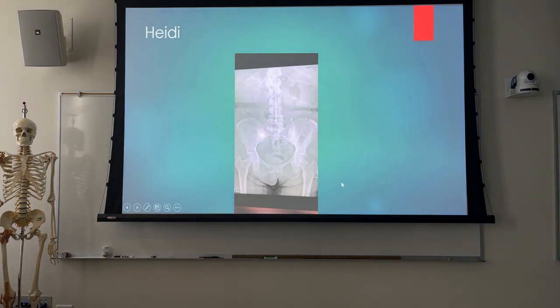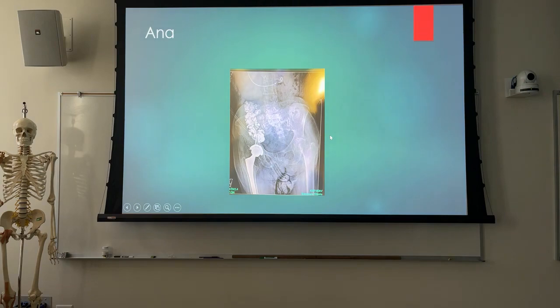So on the flip side of that, I mean, we can see the pathology that we want to see. We can see the kidney stone there, but we certainly could have been centered up on that a little bit better. A little more of the abdomen, a little less of the other stuff. Kind of same thing here.